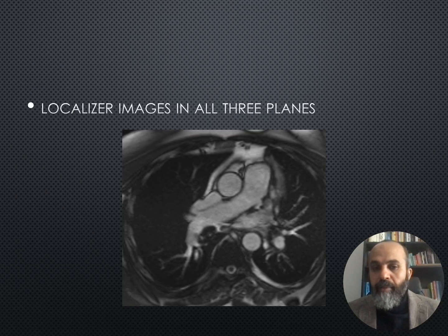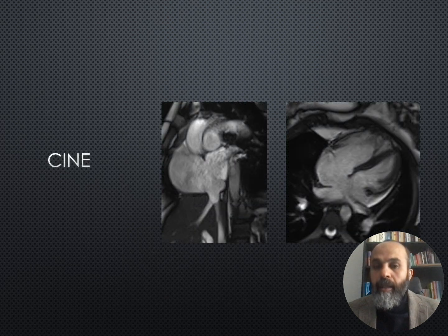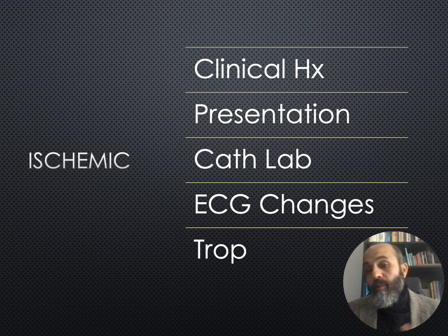Similar for the example in the cine images, when we detected this, I promise that I'm not going to go through congenitals, but for example, that was an ARVC request, again, there was a big ASD, so we didn't give contrast. We didn't do it as a cardiomyopathy protocol. So invest with the patients, invest in going through the sequences in a structured or a systematic approach. Then that would help you to tailor what sequences you need to serve an outcome for the patient.